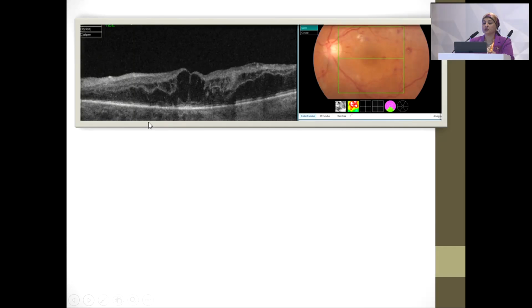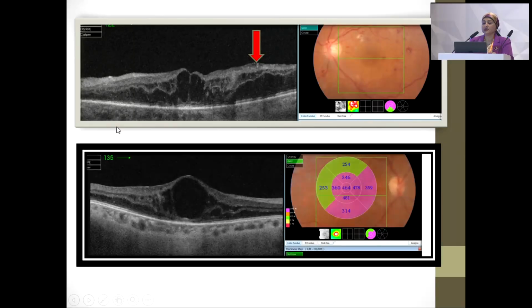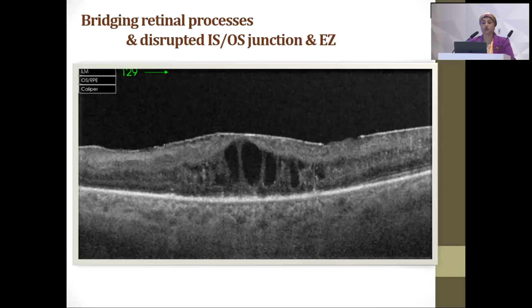And if seen disrupted, and also with the disorganization of the inner retinal layer with the cystic spaces, this denotes ischemic changes. And here is a large intraretinal cystic space with marked thinning of the overlying inner retinal layer, and also there is disruption and high reflectivity denoting RPE changes in the subfoveal space. All these criteria will denote bad prognosis with treatment and post-treatment.